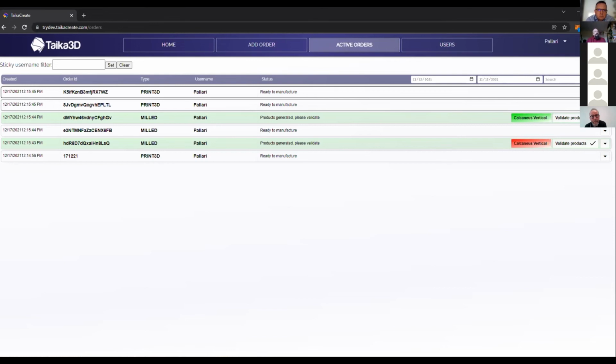That's how you can scale up your device production, and you've got all sorts of possibilities with the designs that can be programmed in, and that all depends on what the customer wants. And this is just a small set of functions and different features that we can do.